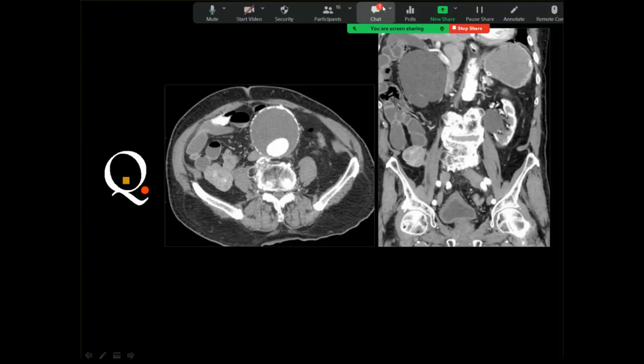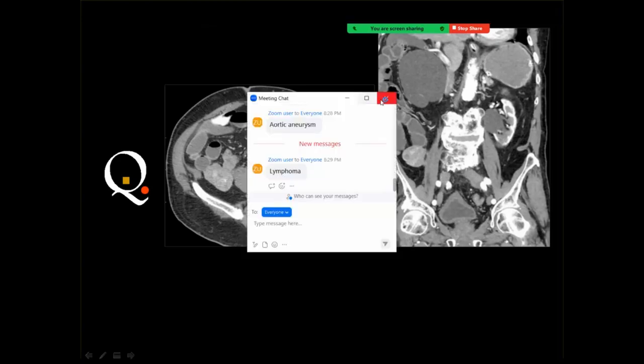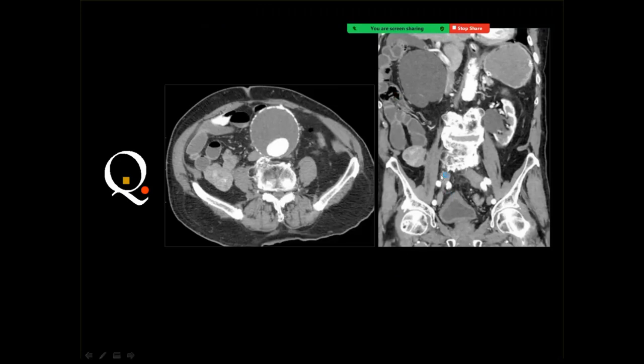Okay, if you are confronted by a lesion like this, when you are not able to adequately locate the lesion, whether it is in the mesentery or it is in the bowel, then if it is in the mesentery, it will represent carcinoid tumor.